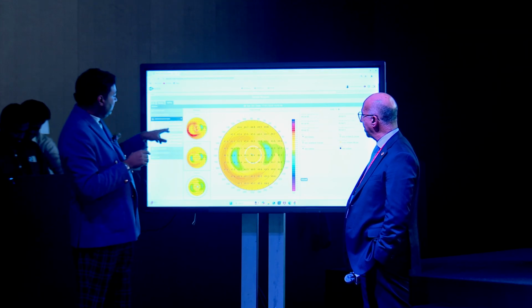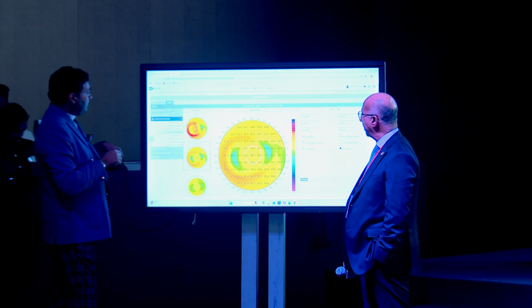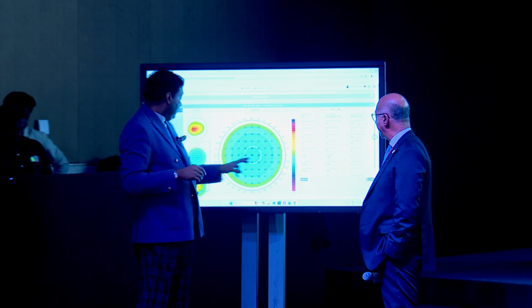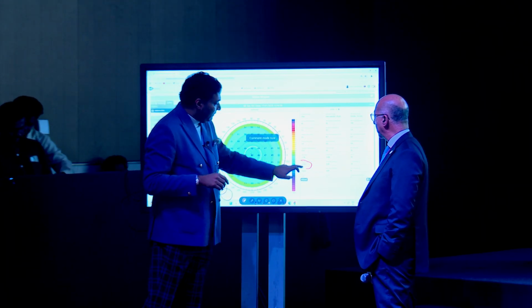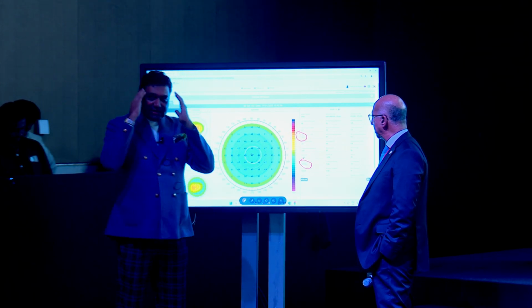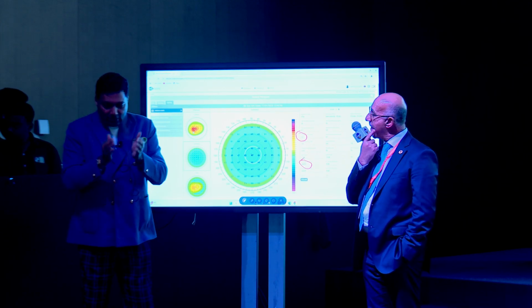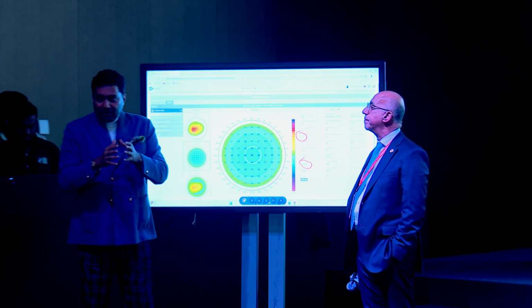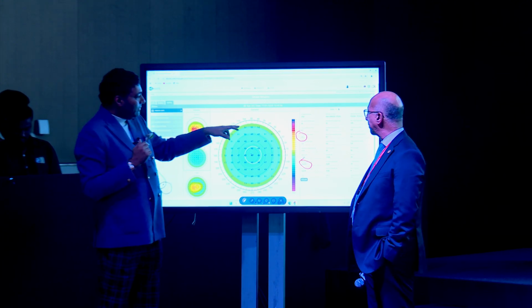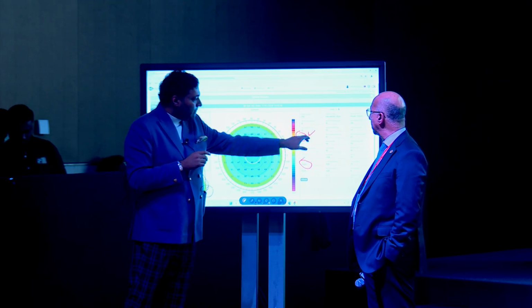What's interesting here is if you go to the surgical planning again, you can see that at the end of it, the machine says that I will make your cornea around 44. I'll keep it in that zone. And the zone is 3.2, which took a long time for refractive surgeons like us to understand, because we always assumed that you cannot go smaller. Of course, people have used it for a longer time. There are challenges, but this is a concept not based on how the ablation is. This is a concept from your pupillometry.